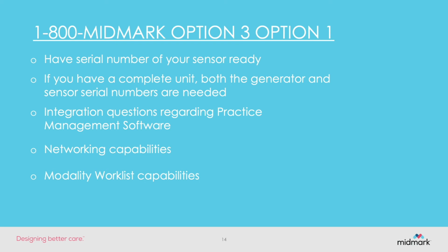We also have networking capabilities. If you want to keep your imaging software as a standalone, but you would like to view images on multiple workstations in your practice, we can help you to network that software so that you can view and show images to the clients in the exam rooms, or you can look at these images in your office to review a patient's images at a later time. We also have modality Worklist capabilities, and our technical support team can discuss those options with you as well.